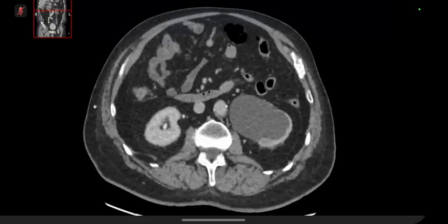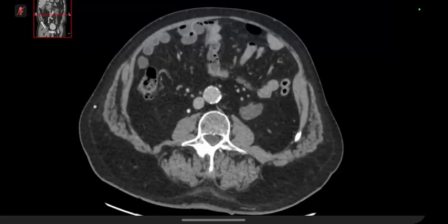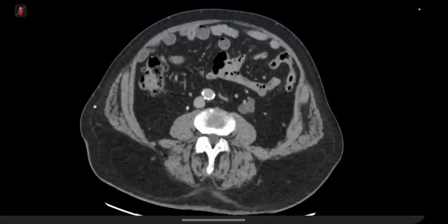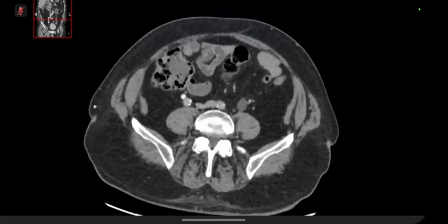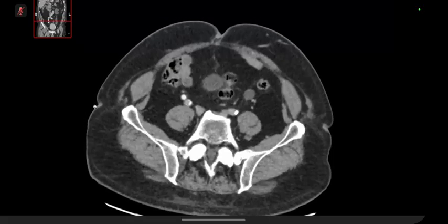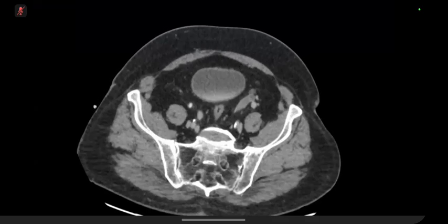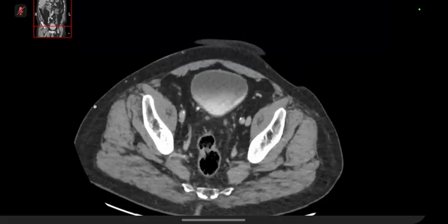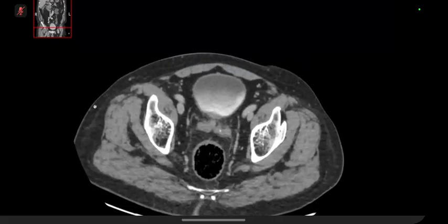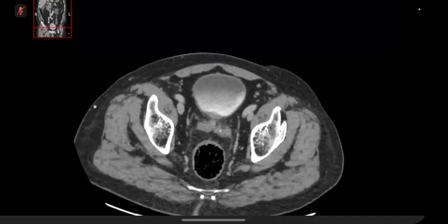I'm trying to trace the ureter. Yeah, so the ureter also appears to be dilated. So it's not a pelvic-ureteric junction obstruction or something like that. But there are multiple outpouchings that I note that are arising from the ureter. And okay, the distal ureter appears to be narrowed, or we can say that this is a normal part of the ureter.